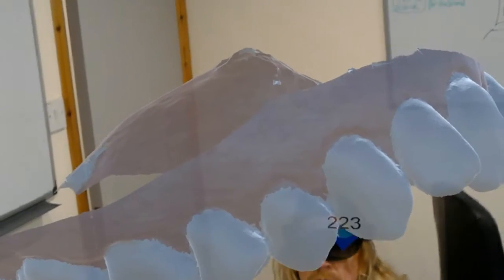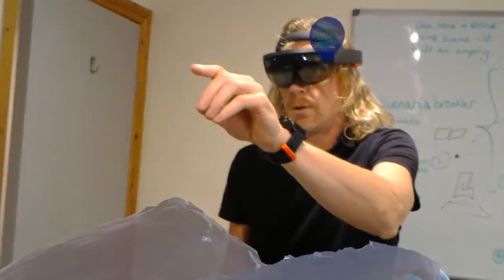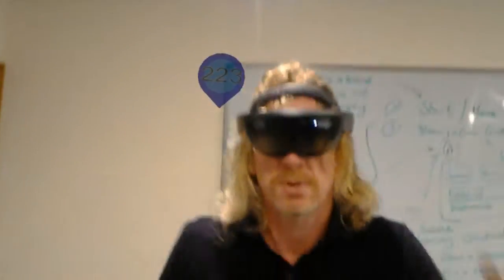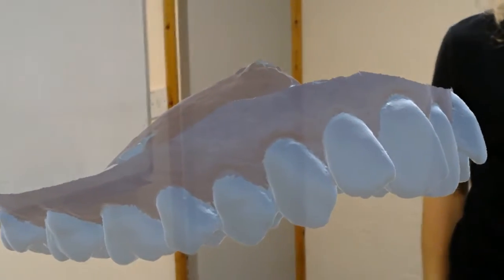Okay, great. So perhaps there'll be some opportunity to change how we see this by opening the mouth at some point in the future. That's something that we could work on, yeah. So change the orientation of the teeth to make it easy to look at the underside. Yes, that's potentially something that we can work on.